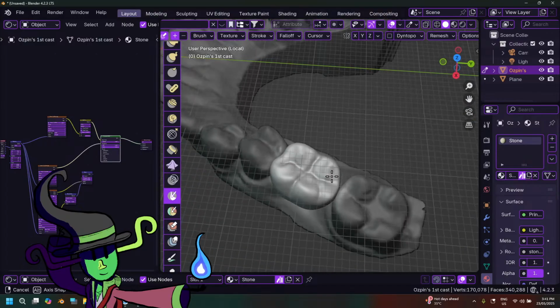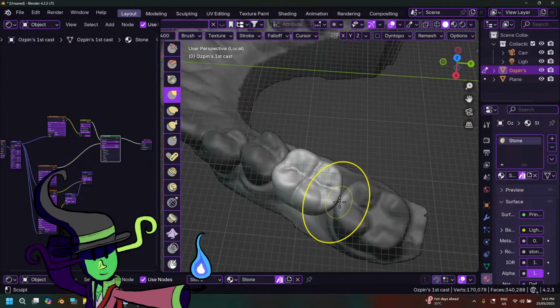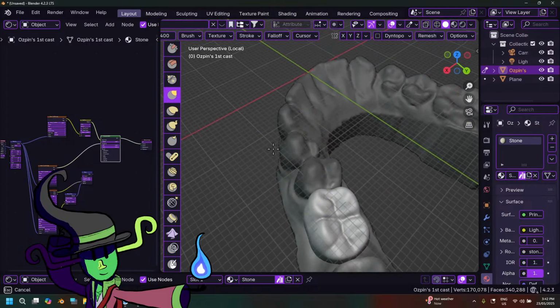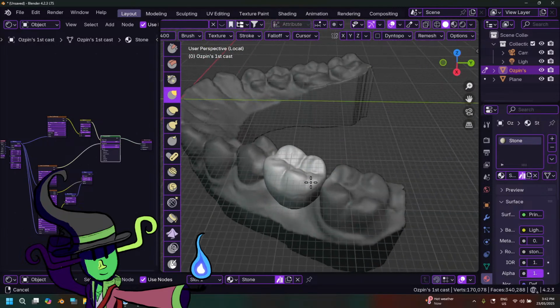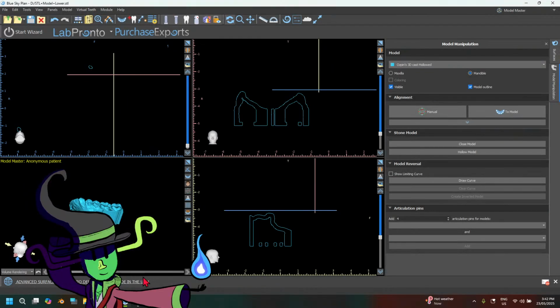Control I. And then, if I just want to edit stuff out with a tooth and not affect everything else, see, look at this. If I try to move this, it doesn't work. I'm left clicking and dragging, and it's not affecting it. Only the thing that's not masked out is going to be affected. Well, why doesn't Blue Sky have a sculpting tool here?